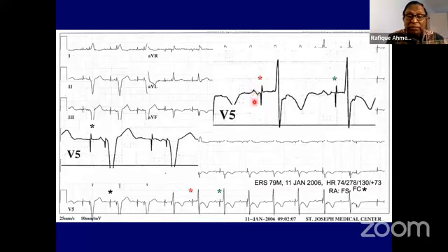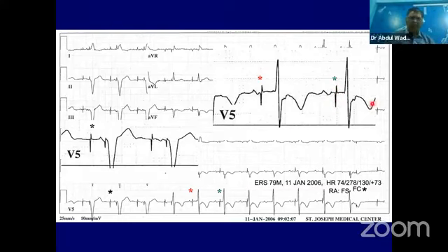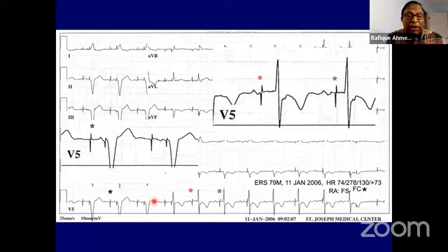It is possible that maybe there is a blanking or something happened and he did not see that. And timing, or the pacemaker already made a decision to pace. But this one, clearly, there is a P wave, but still there is an atrial pacing spike. Now, how do I know it's atrial pacing spike? Because ventricular pacing would have captured it, because it proved in the very beginning that it is able to capture the ventricles. So basically here we have intermittent failure of atrial capture and sensing failure.